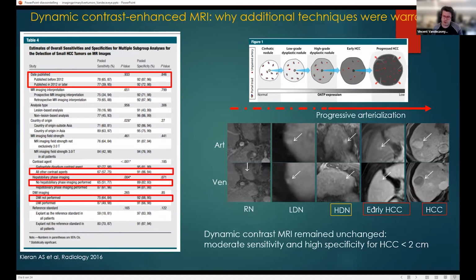This was then the resulting pathological diagnosis, but here we have already the clear characteristics of a hepatocellular cancer, arterial enhancement, and washout. You can see the faint hypointensity compared to the surrounding liver parenchyma. And this is a straightforward hepatocellular cancer, arterial enhancement, a capsule, and really very clear washout.